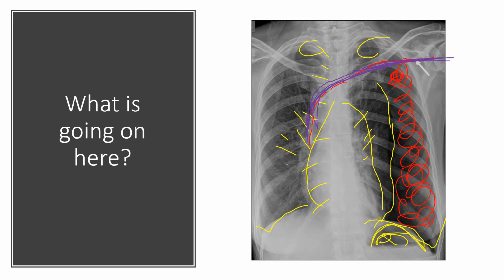A central venous line. And then what do you notice is behind the clavicle, where this line is being woven into the superior vena cava? Yeah, the lung. The lung's right behind the clavicle. So is it possible that they could cause a pneumothorax while placing a central line? Absolutely, especially if it's a subclavian line like what you see here. So this is them inserting a CVP. One of the classic things they do after they insert a CVP is go ahead and get a chest x-ray to rule out this type of situation, or to make sure if it does happen that we take care of it early on.